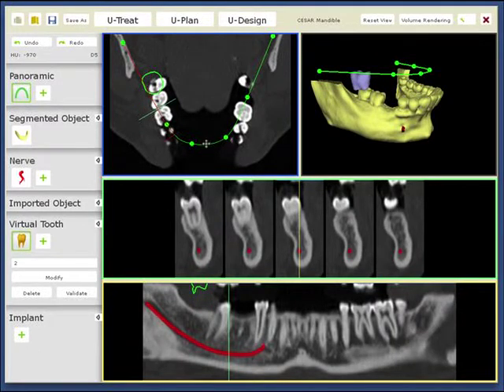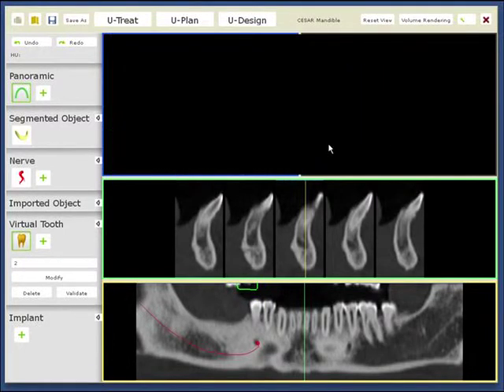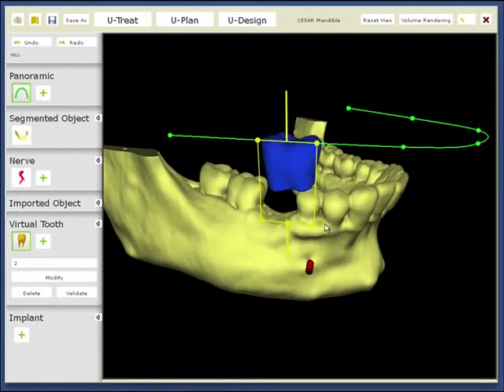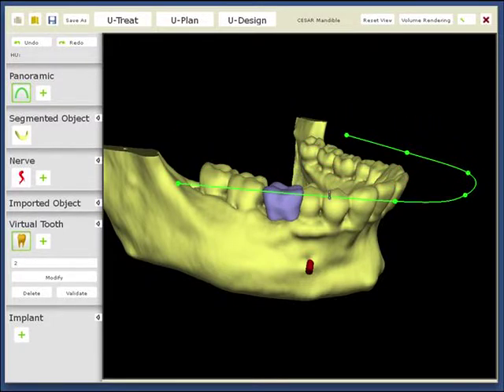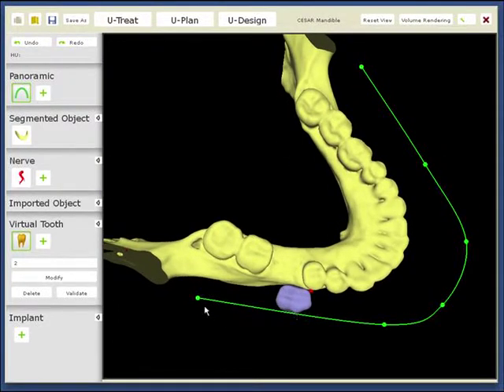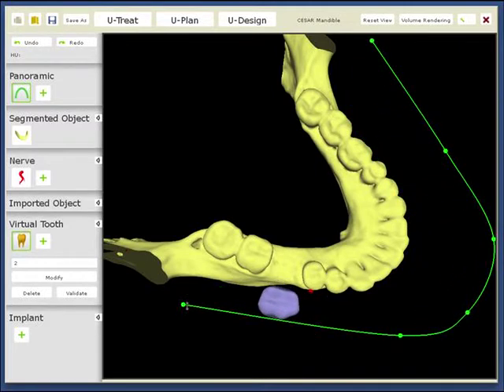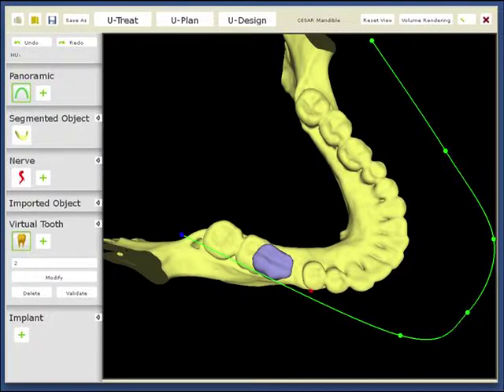I am going to change the position of my tooth, and I'm going to show you this. This is the way to change the size of the tooth in height, in diameter. I can put it in now. Okay. I can just change the position because it's not in the right position. I need to move it back. I need to move it inside. I take that, I take this, and I get my tooth.